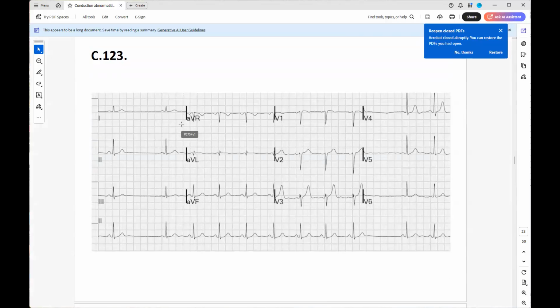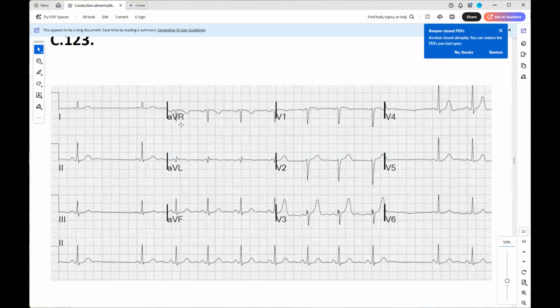I think based on the continuation of lead 2, it's not non-rhythmic. So I counted that there are 11 beats in 10 seconds, which is around 66 beats per minute. I recognize QRS complexes in lead 2 and 3, and they each have a P wave. I tried to estimate the distance between the P and R, and it was less than 0.2 seconds. So I think there is no AV block visible on the ECG. Very good. But otherwise, I'm not sure what conclusion to draw. Okay, no problem.